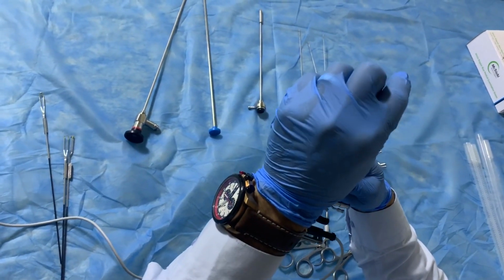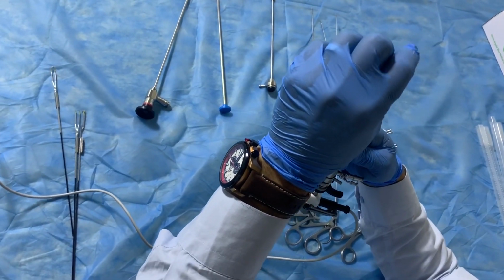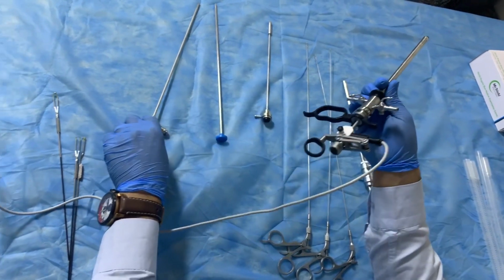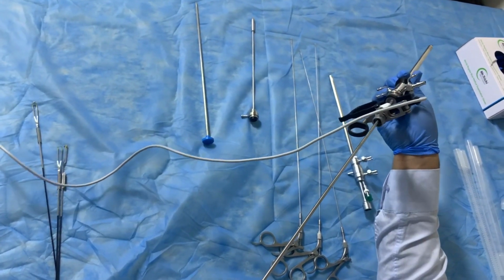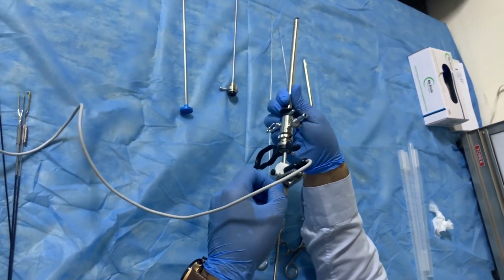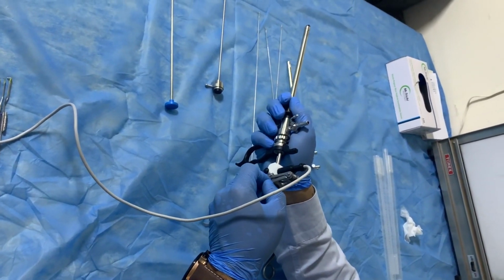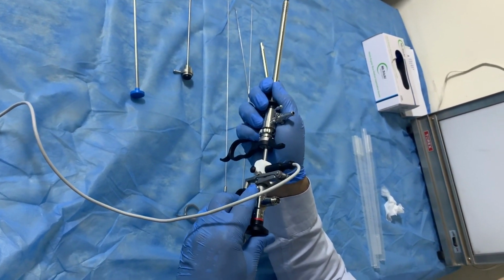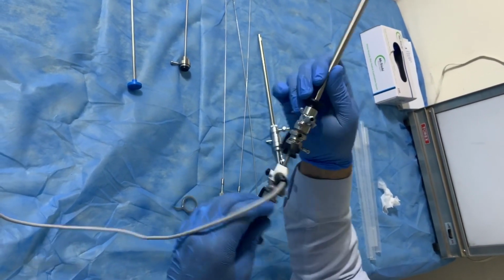The electrode should be disappear because when it is occur outside it may be create a trauma. Now the telescope should be passed inside, but before push it should be line parallel to each other. Clockwise. Now it is ready for work.